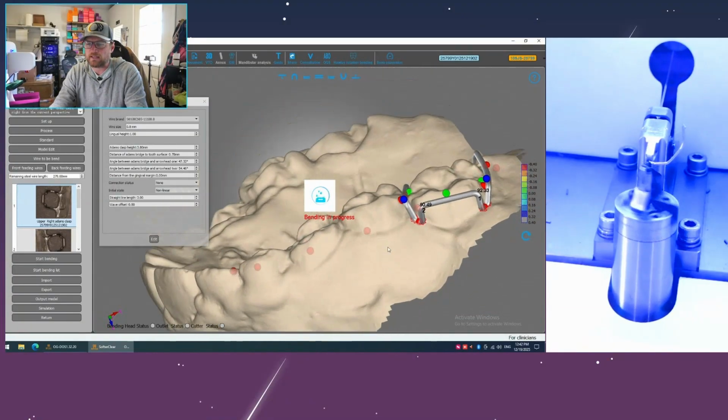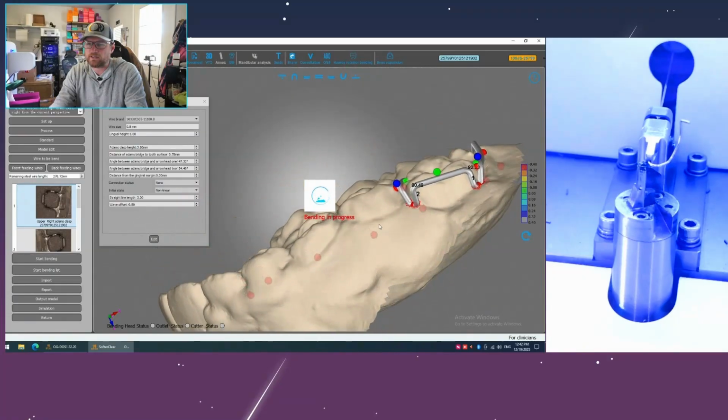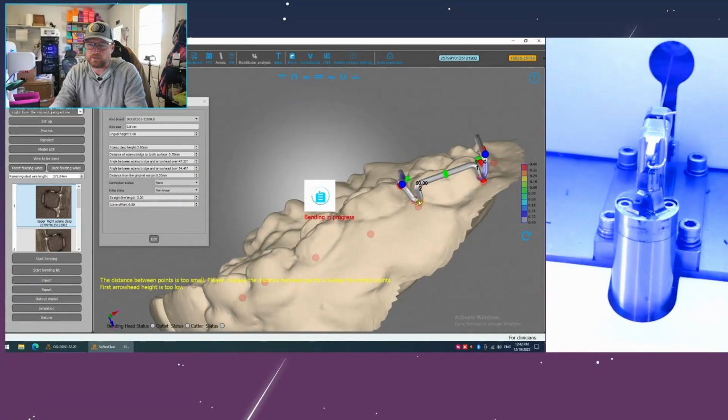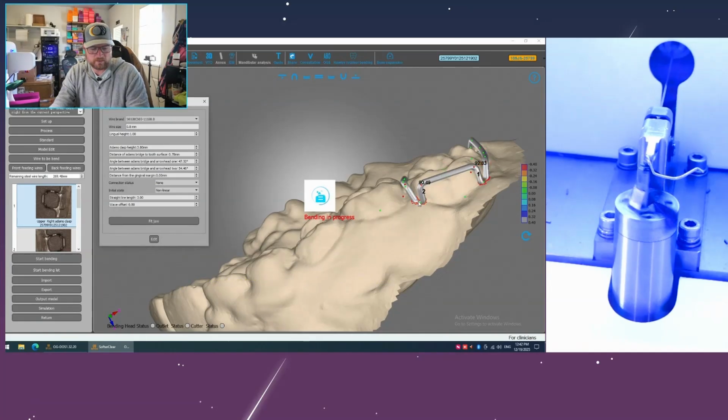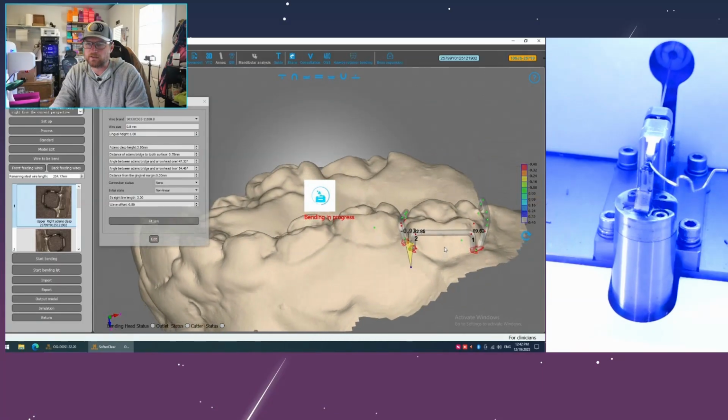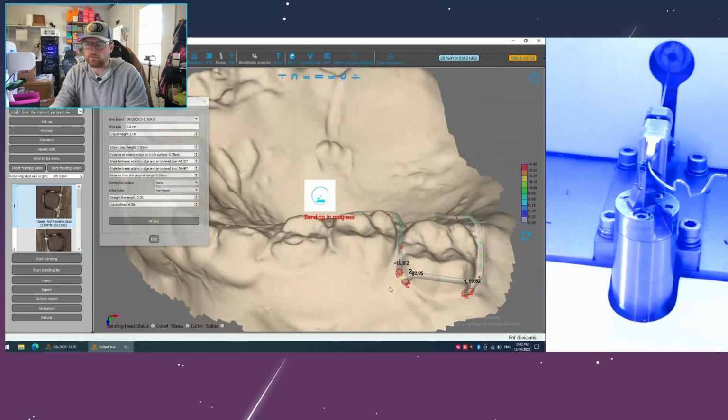I do like these. That's pretty even. At first I thought this was longer. I feel like this needs to be, ooh, let me undo that. I'm going to hit P and Control, and I'm just going to drag that. That way it's grabbing in the same spot on the tooth, and it's still level.